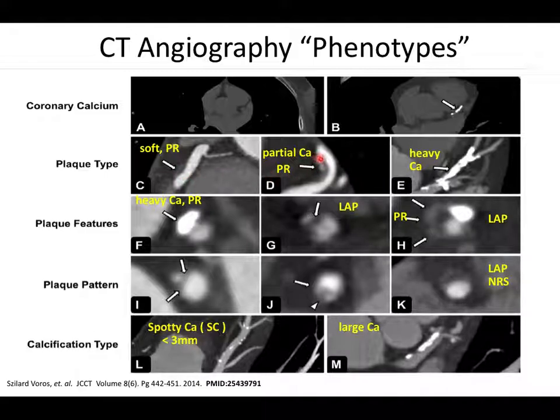Here's one where you have soft plaque. We saw this in our volunteer before, and a little bit of calcium in the middle, right? But you can actually visualize the fact that there's soft plaque outside here. And here, this is usually what you see in a person who's like 70, where they've had these over and over again, and they've resolved, and it's left behind this trail of plaque, which is heavily calcified vessels. It's almost like building your own stent. Like this huge calcified vessel by the time you're 80.